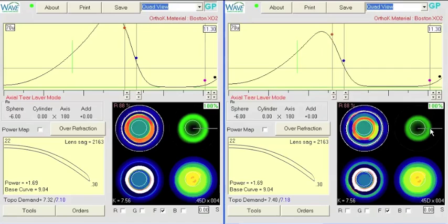And we're there. I'm going to go around to the different meridians and make sure they're all fairly close to target. And on some of these, especially this one, for example, I think we can be a little bit closer. So I'm going to go to 25% mode and drop this a little bit. That's a little better. Okay, so now we've got a smaller OZ, more lens aligning perfectly on the cornea for hopefully better centration.